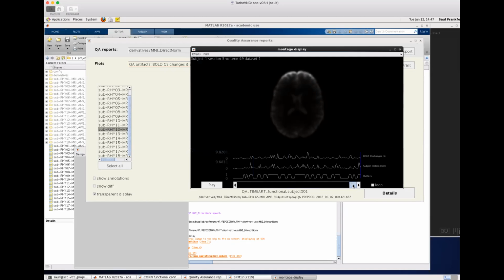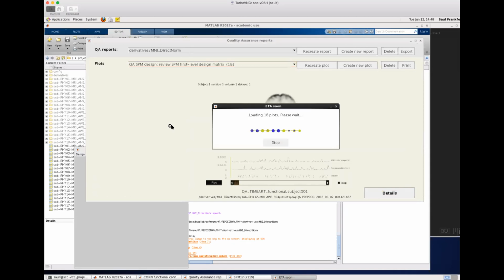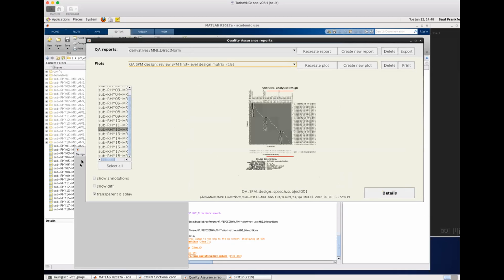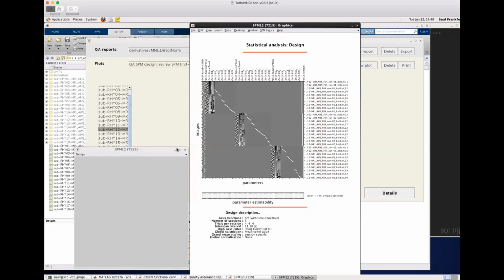Okay. What do you see first? I mean, this is all across. So the portions that don't have a lot of motion that haven't been removed still show relatively consistent motion. So that might be problematic. And the question is whether it's correlated with the task or not. So, I mean, oh well. So I just look at this.